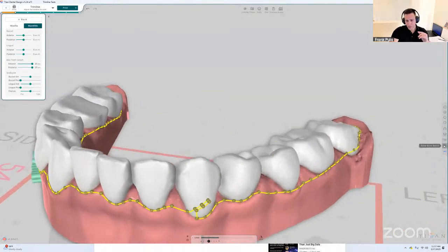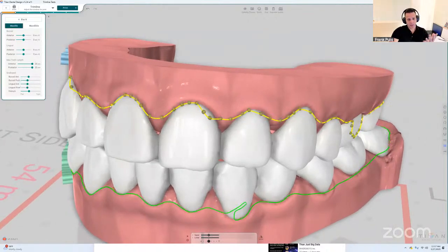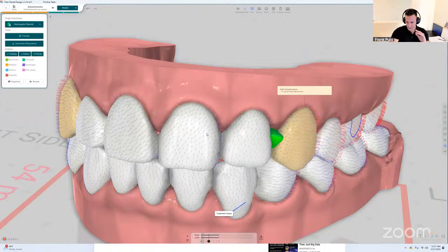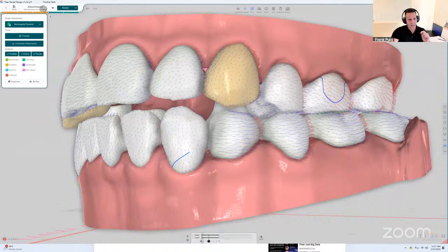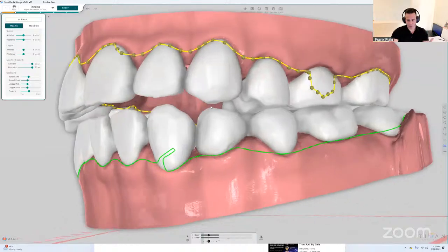Another thing that we improved is the precision cuts. So let me go back here. Where is attachments? So in the attachment steps, I place one precision cut here and one precision cut here. And when I go to the trim line, it automatically creates those cuts in the trimming.